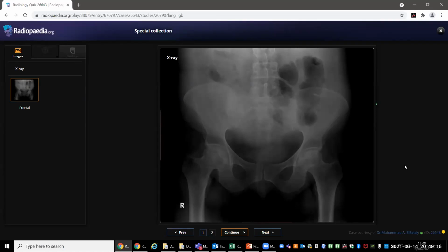Okay, I believe this is your last case, right? Yeah, my time is up, yes. So yes, this is a case of bilateral AVN. The cause is not showing on this radiograph. It doesn't have to. It's just for you to, like you mentioned, I'm looking for this. So it could be sickle cell. I can't find any features of that. I can't find any features of renal transplant. This patient could be a chronic alcoholic person. Right, you have chronic pancreatitis. So you just mention as many as you can. Just keep talking and try to move on.